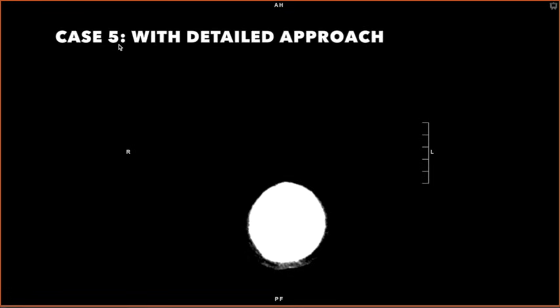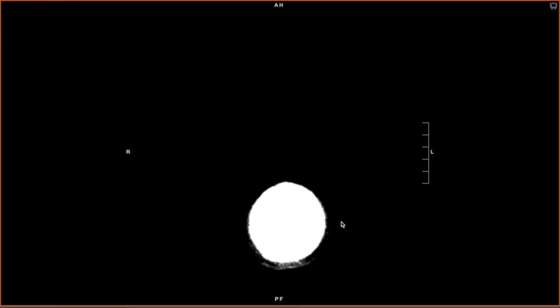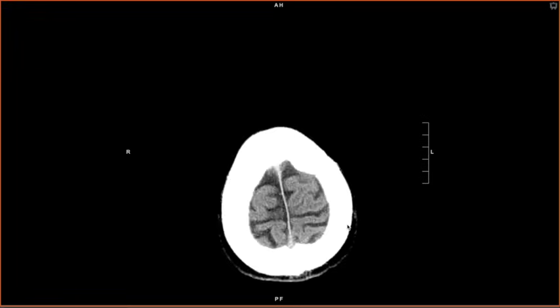Okay, for the future radiology residents and the radiology residents out there, let's go through a more complete approach that's a little bit more detailed and looking for more subtle findings. This is a subtle case. This is a patient who came in with a trauma. Again, similar principles to what we talked about in our conceptual approach.